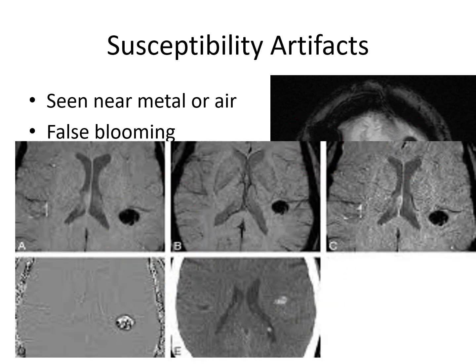Now in the next image we can see a dark blooming in the brain seen in the magnitude image, MIP as well as in the susceptibility image. So in all three sequences this lesion appears dark or blooming, whereas the phase image shows reversal of signal intensity, that is, bright. This is due to calcium deposition in the brain. So this differentiates blood from calcium deposition, and this is confirmed by the CT scan image. This is the lesion showing calcium deposition or calcification in the left parietal lobe.